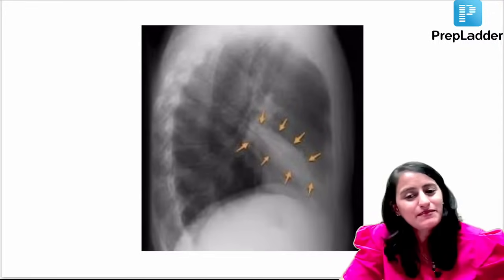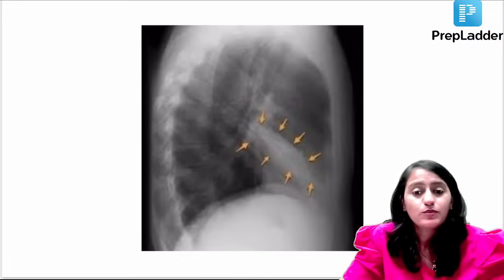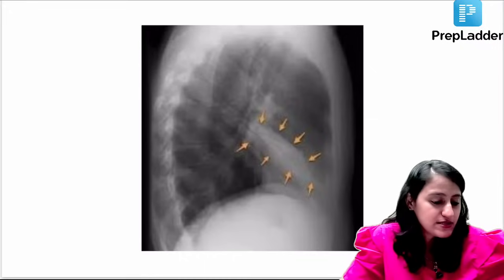Yes. So tall male indicating Marfan's. Marfan's ka history common diya jata hai spontaneous mein. This has been asked in the FMGE exam. What is this?